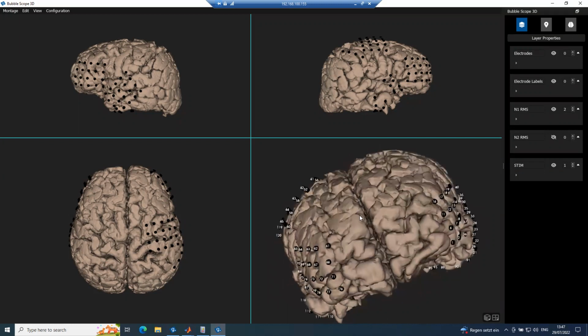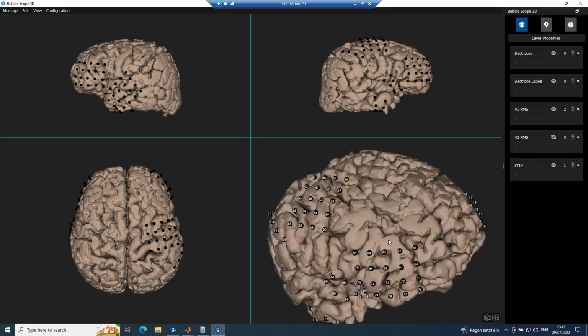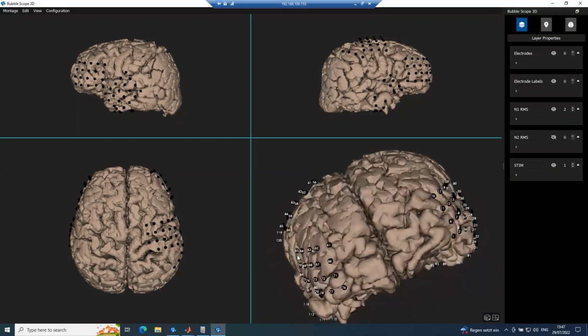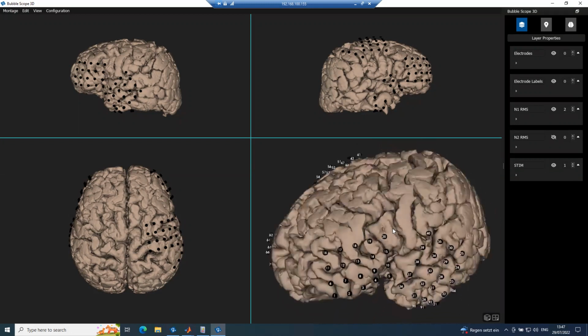But if you don't have pre-recorded data and you want to use it with an amplifier, it's necessary that you run the iEEG Montage Creator to create this brain model, which includes the information of the electrodes, the grids, and also the anatomical landmarks, the atlas of the gyri.